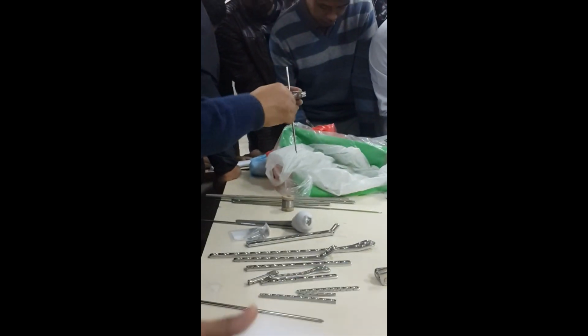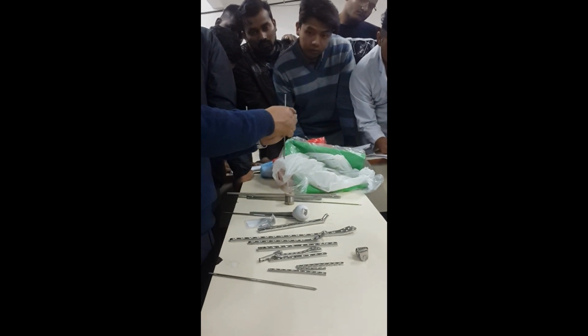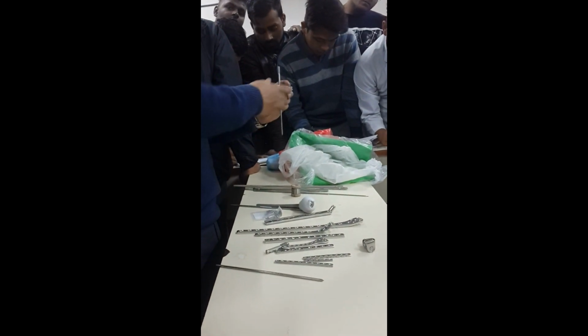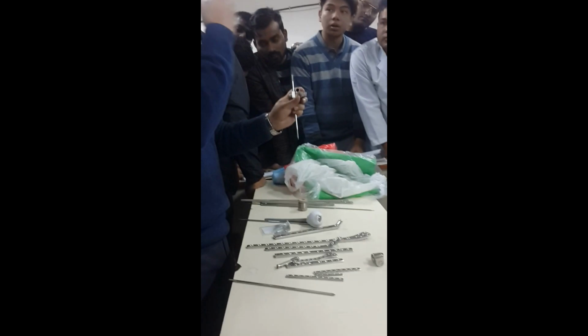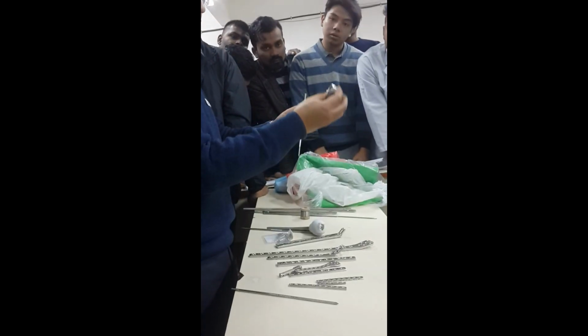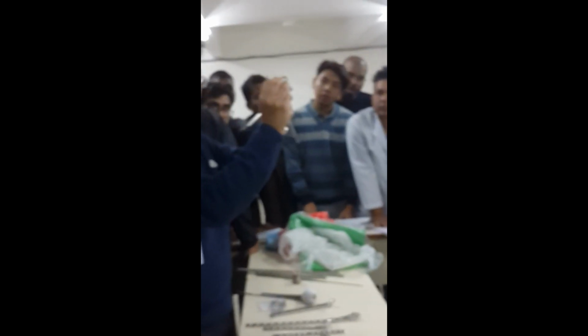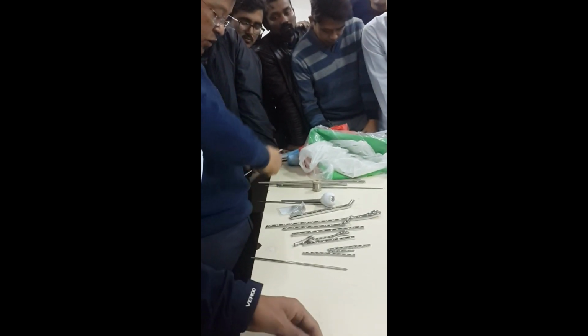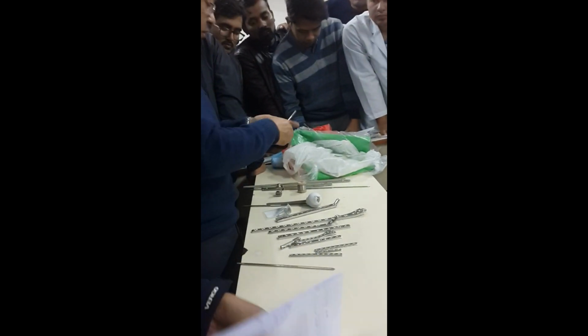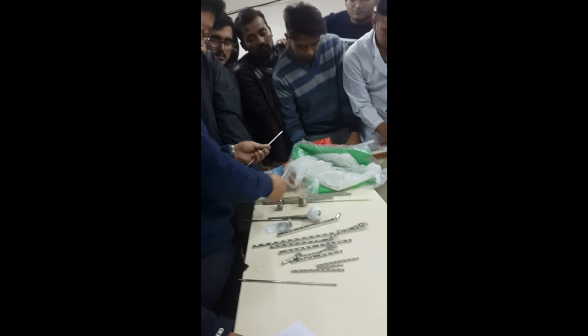Okay, and suppose you have a rod here. You have to connect rod to rod. Okay, the rod to rod clamp is quite different, though the way is similar. Same hole. The same pair comes like this and connects one rod, which is longer, to another rod. Okay, this is the rod to rod clamp, and this is the universal clamp.